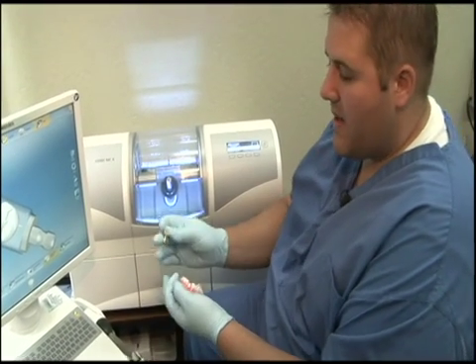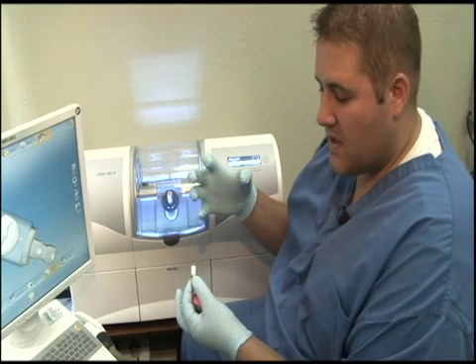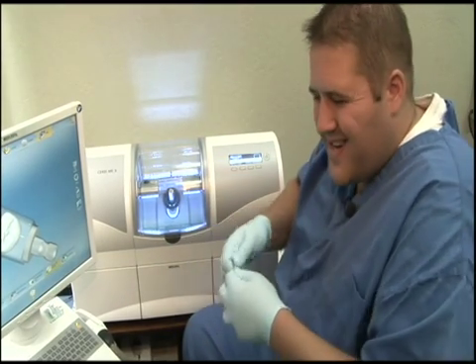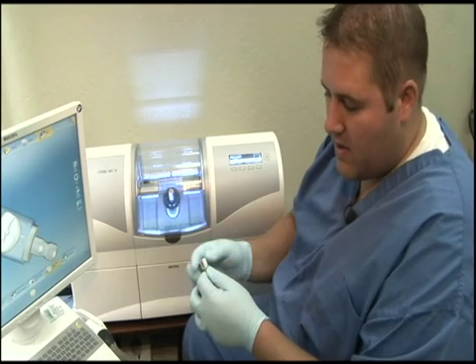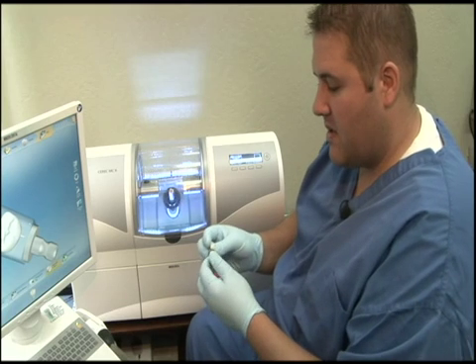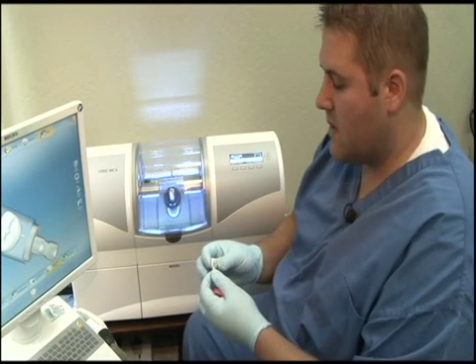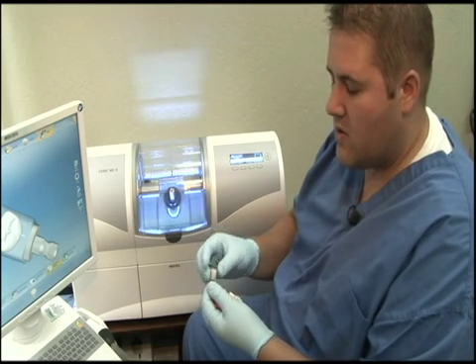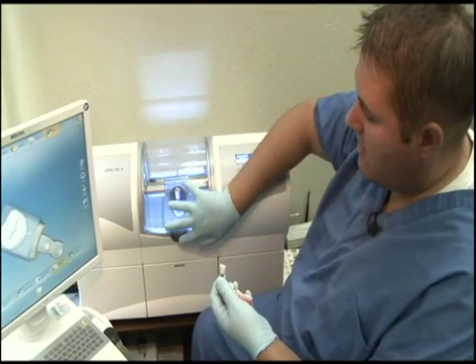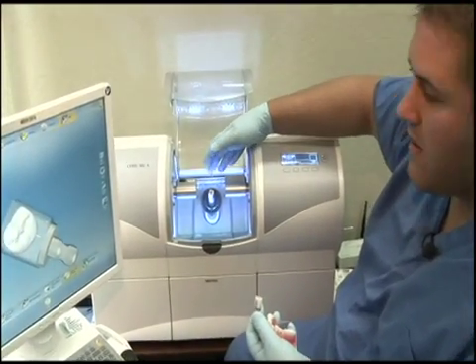What is so wonderful about Cerec is that the blocks of porcelain are created from a solid block created under pressure. So it's extraordinarily hard. I could take this out and put it under the tire of my car and run it over, and I would doubt that it would break or chip. It's very, very, very dense and very, very, very strong. In fact, it's so dense and so strong that in order to cut it and trim it into the crown that we want to put in your mouth, we have to use very hard diamond-coated drills. And so what we're going to demonstrate is how that process happens.